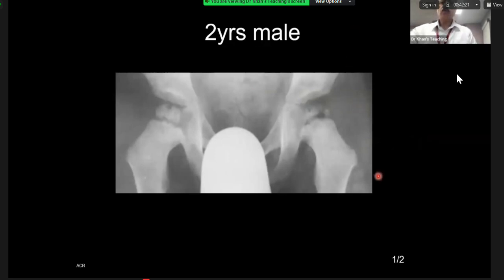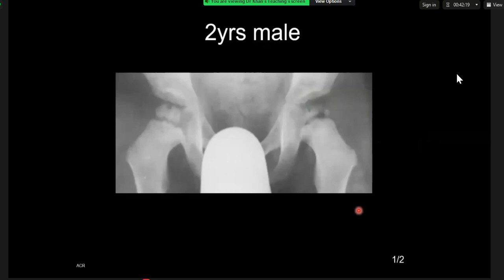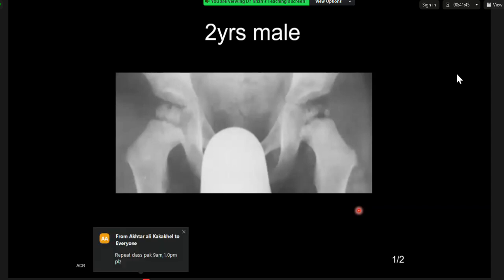So, over to you. How will you describe this? So this is a frontal pelvic radiograph for a 2-year-old male. The bilateral femoral epiphyses appear sort of slightly stippled in appearance with irregular margins and some loss of height on the left. There's also possibly an associated effusion on the left-hand side. No other abnormality is seen.